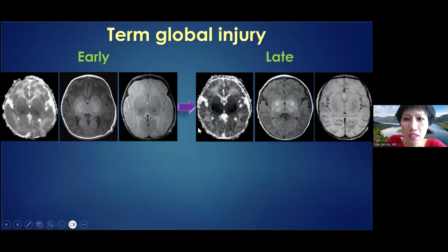Too much edema here. So on follow-up, it's actually bloomed, right? So this was like 1 or 2 days. This was 5 days. And so you see that doing it too early, right? Doing the imaging too early can actually really underestimate the degree of end-stage injury. So here, yes, there's central pattern, but there's really diffusion restriction, profound basal ganglia, and really diffuse edema. You lose that gray-white distinction.